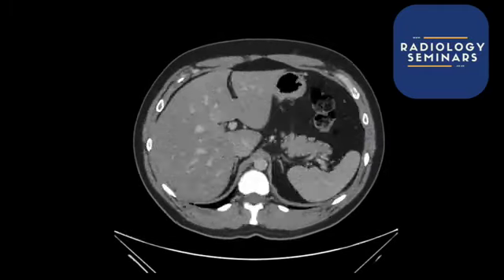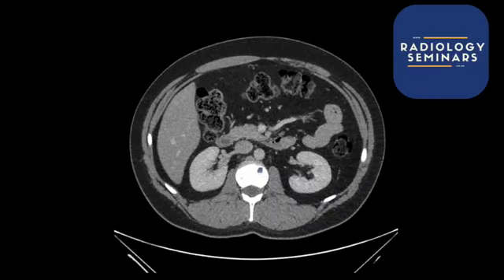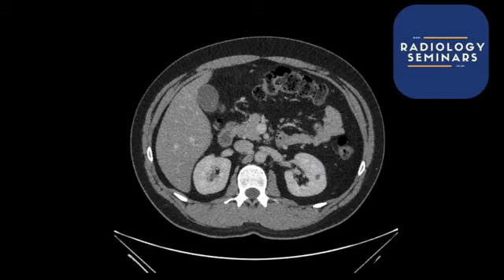So the way I normally do it, maybe it's a bit rudimentary for some, is when you come down to the kidneys, you can actually see some of the detail with regards to the cortices, and also that the aorta is slightly more dense than it otherwise would be. When you've got a non-contrast scan, that wouldn't be the case. You'd have the same density with the liver, the kidneys, the aorta, the IVC, all the vessels, all the bowel would be exactly the same density.